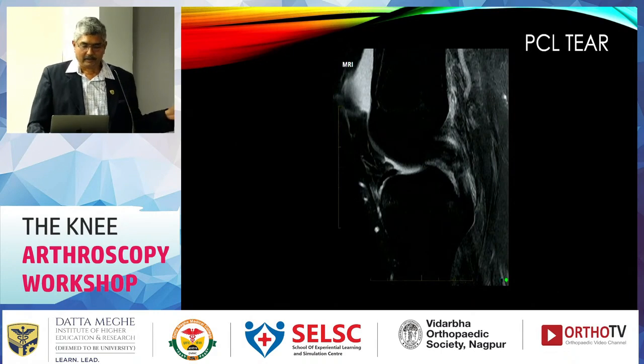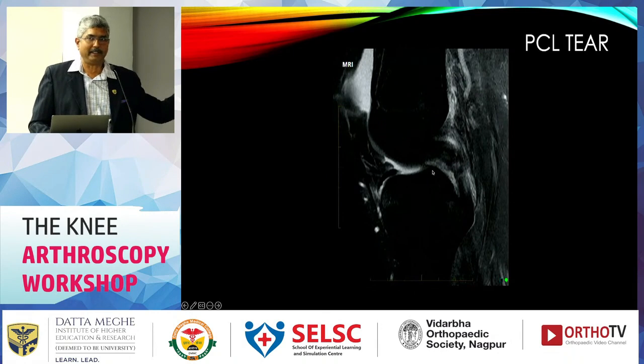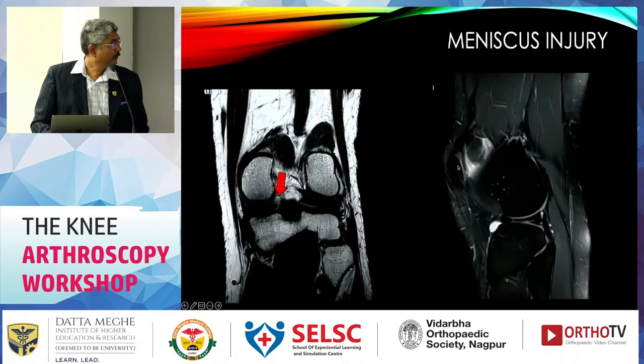PCL tear. Again, PCL tears are somewhat rare as compared to the ACL tear. I had come across most of the time avulsion rather than tear. Such a strong ligament is the PCL. But here PCL with altered signals and disruption of the fibers is pointing towards the tear.